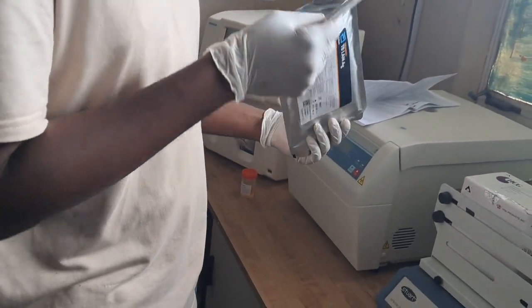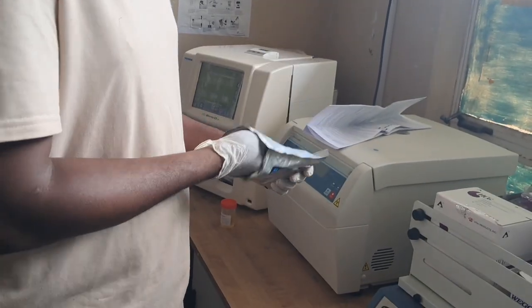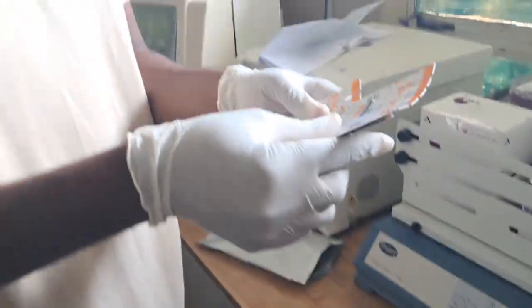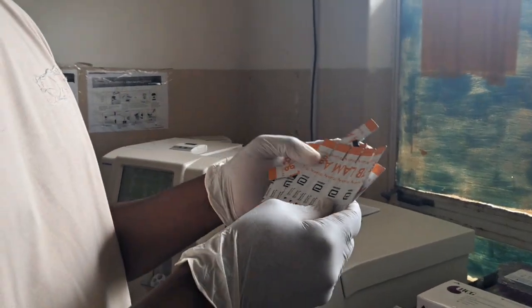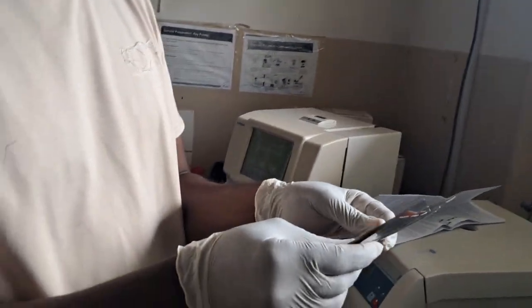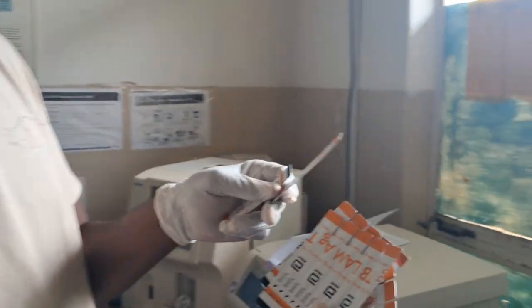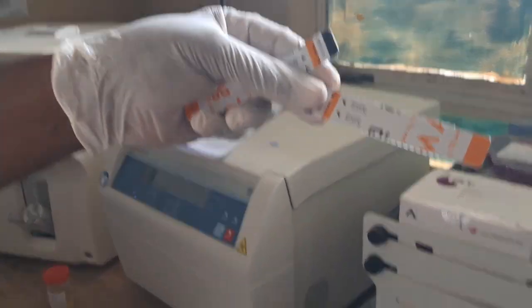Then here comes the test kits themselves. So these are the test kits. This one, like I said earlier, we've opened it already. So these are the test kits.